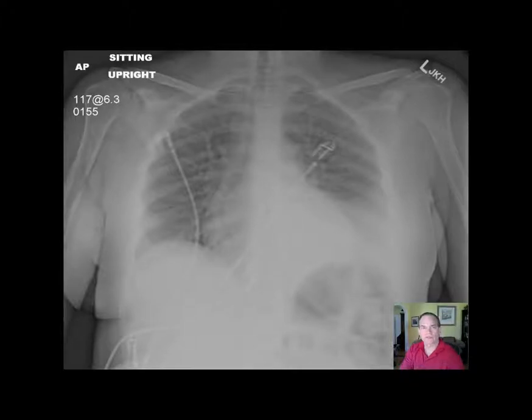Hello there, this is Dr. Mintz. I'm going to go over this chest radiograph and give you an idea how I go about reporting cases. I always start out first with the patient's history and then go through important positive findings and also make sure I mention the relevant negative findings, things that look okay.